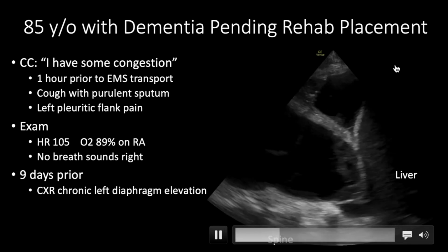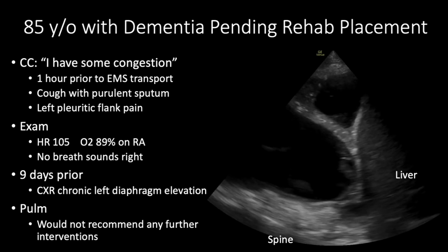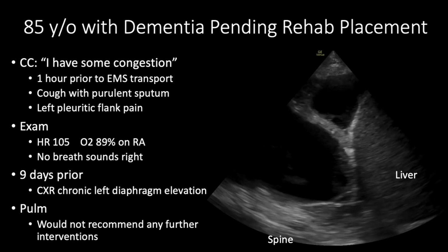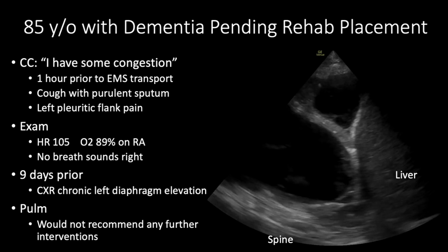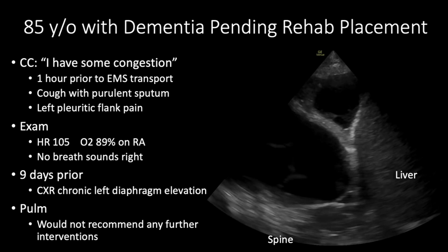The pulm was consulted prior to any formal imaging, just with our bedside ultrasound, and they saw this chest x-ray from 9 days prior, and they said, don't worry about it. It's just an elevated left diaphragm causing the decreased breath sounds. We don't recommend any further interventions.